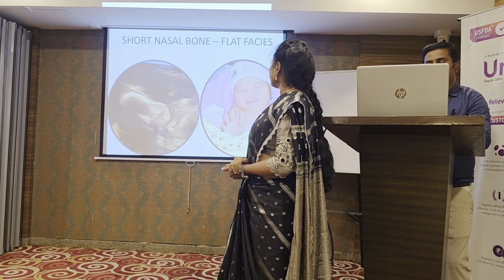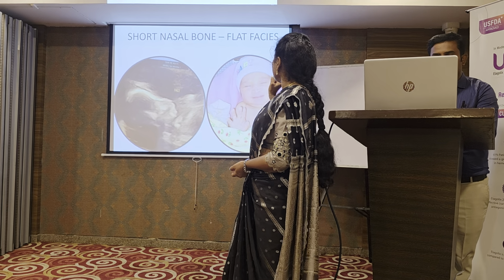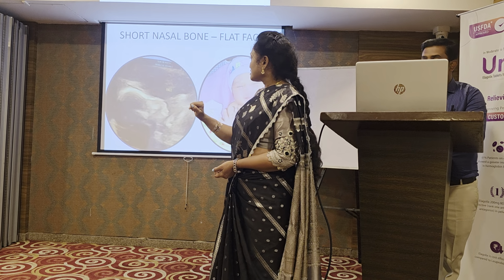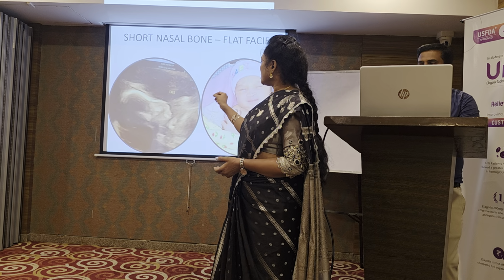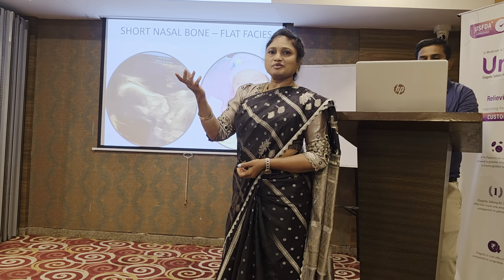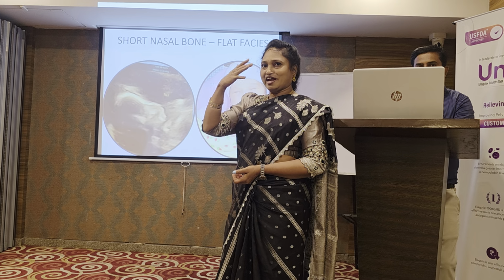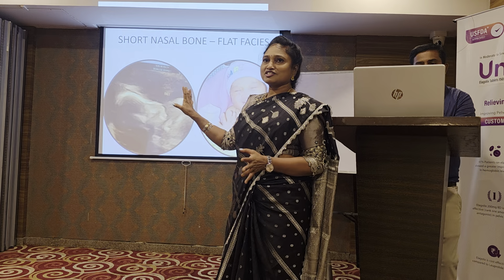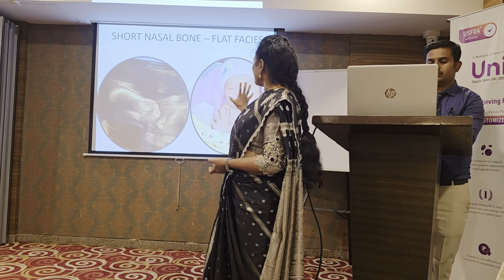Next one. So this was a recent case where there was almost absence of the nasal bridge. The mid-sagittal section was very, very scary, because I couldn't see any nose at all. The bridge was very flat, but the baby was okay. So look at the parents. The parents were from West Bengal, northeast, so they had this typical almost no nose. That was very scary. I thought something is wrong, most probably Downs, but everything came out fine. NIPT came out normal. So baby was okay.